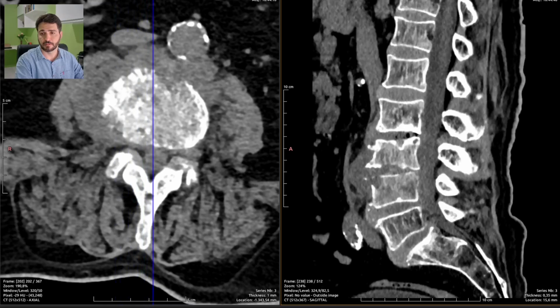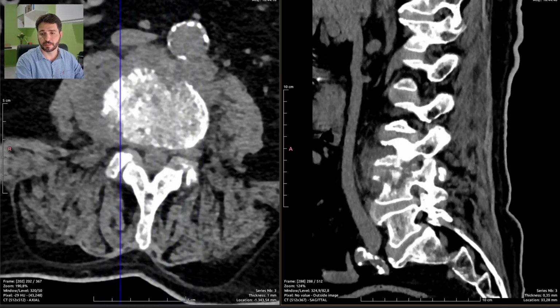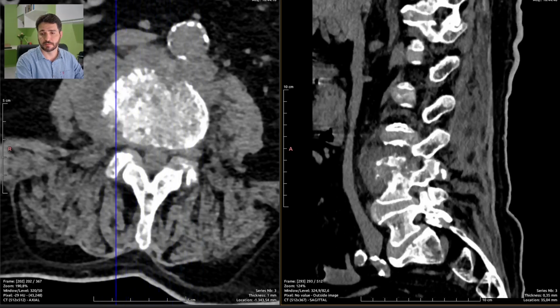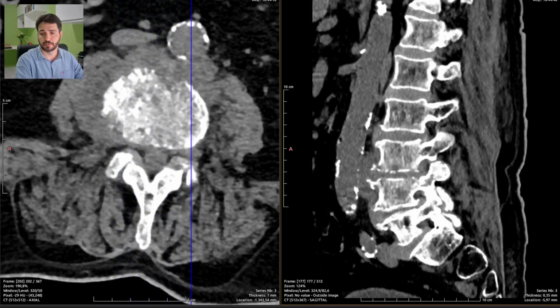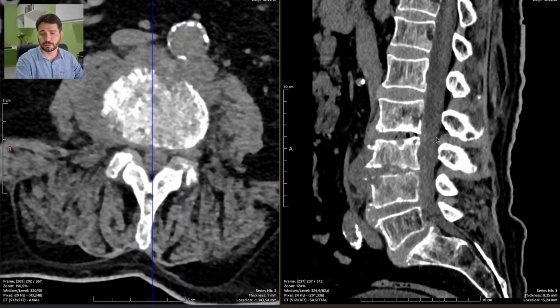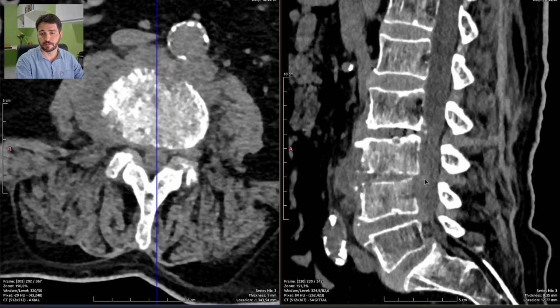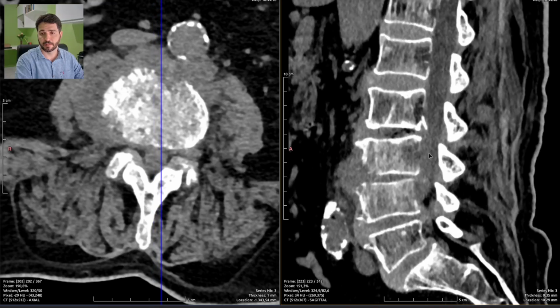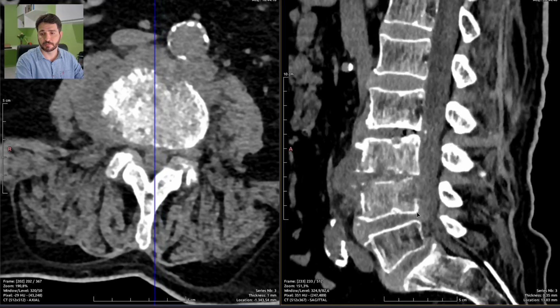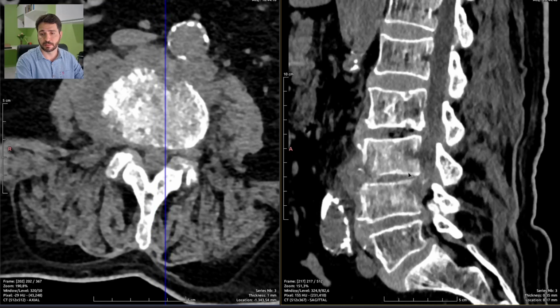Bulging discs all over, severe stenosis all over, arthrosis as much as it's possible, and there seem to be some osteolytic lesions just like here and there and there, so this could really be like that and that over here.